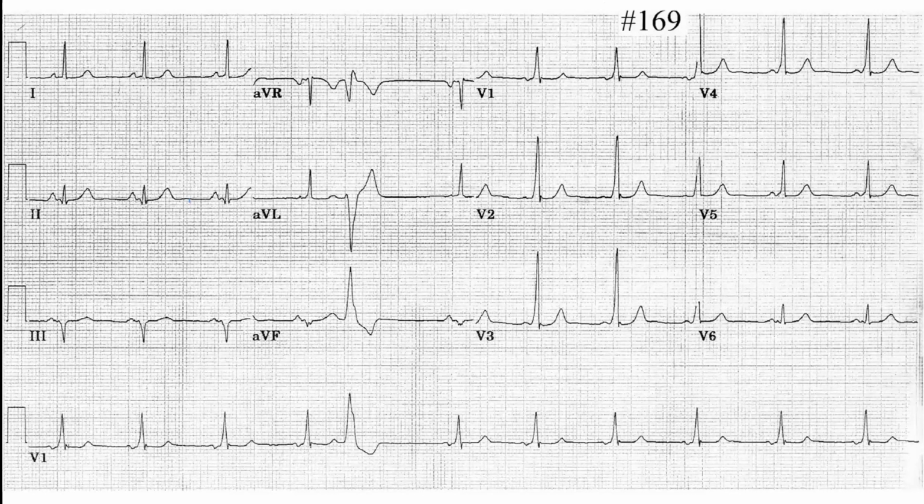Okay, Maximilian. It looks rhythmic. The heart rate is... except here. Yes, of course, that's a big one. So that's arrhythmic, but mostly rhythmic, but something made it arrhythmic. Immediately you can say what kind of beat made it arrhythmic? How would you call this beat?